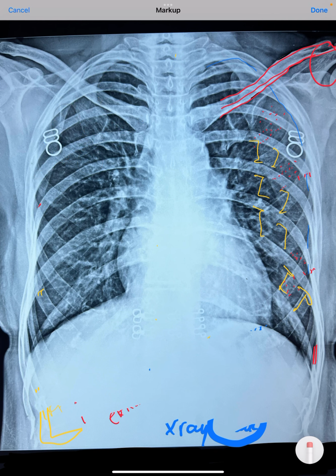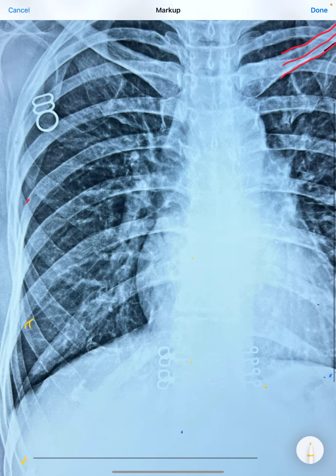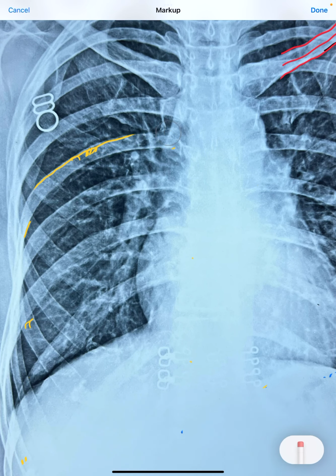In fractures there will be discontinuity in the bone, or there will be destruction. So there can be a fracture here, but here you can very clearly and continuously see both the upper and lower margin. It means that the bone is not fractured.